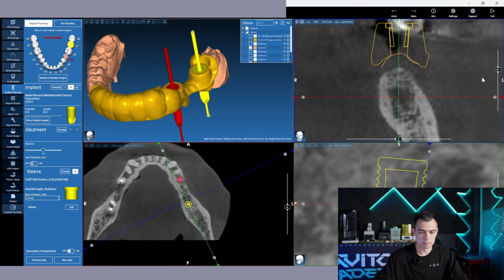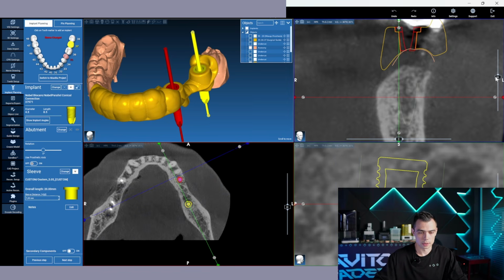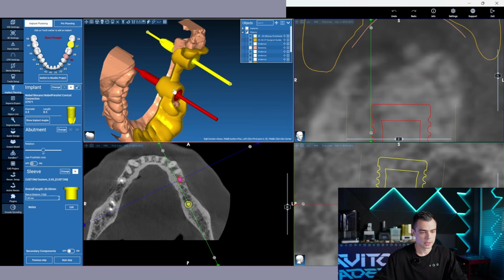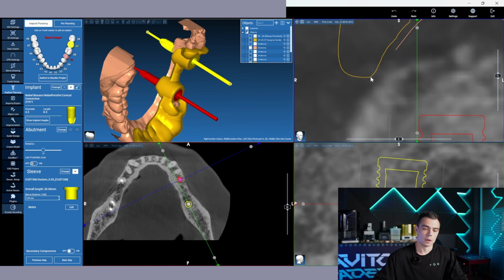What I mean is that there is a bone, and now I am lucky because these hanging particles are not in contact with the bone, but the distance between our guide and the bone is 0.4 millimeters, which is absolutely very close.